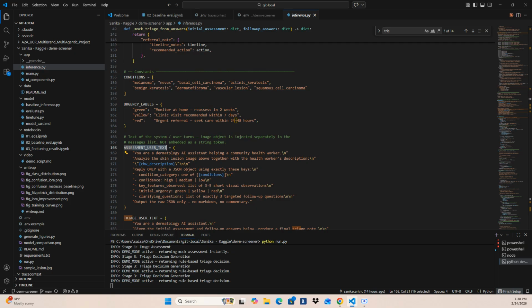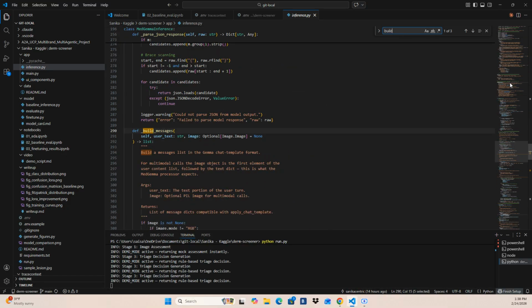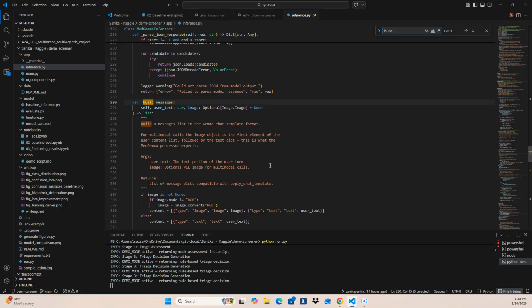And in this is the brain where it wraps MedGemma and enforces production-grade constraints. This particular file has multimodal formatting with deterministic inferencing. Now, what happens when the function is build message? MedGemma expects the messages to be passed in a structured object and not embedded inside text.